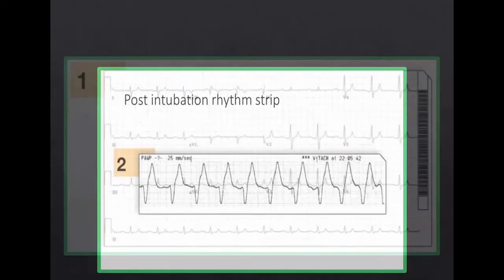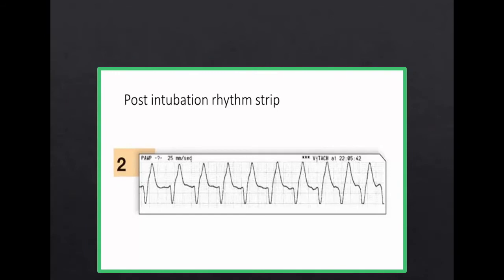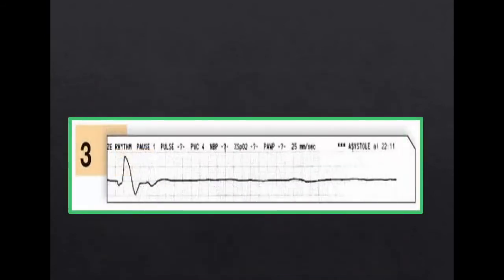Now, this poor patient got really ill, he deteriorated, and my scalums intubated him with etomidate and suxamethonium. And this was his post-intubation strip. And what do you think they thought this was? They thought this was VT. And then they defibrillated him. Not synchronized cardioverted, they defibrillated him. And then he died. And then they said, oh, shame, he was so sick, eh?